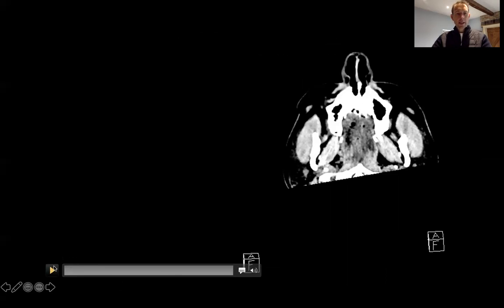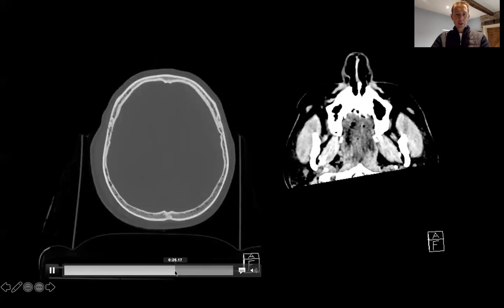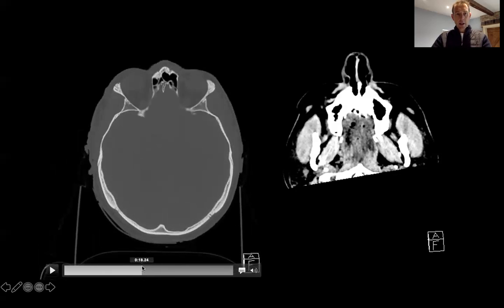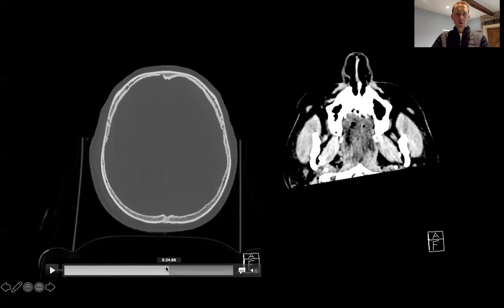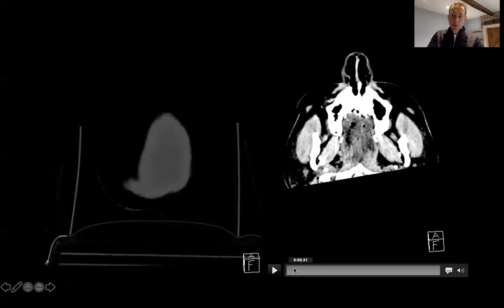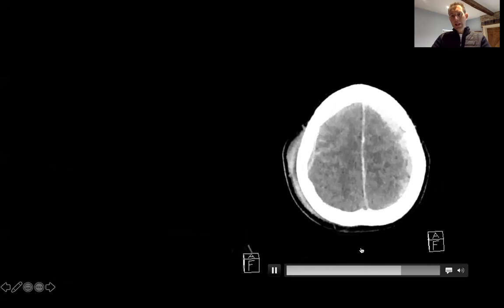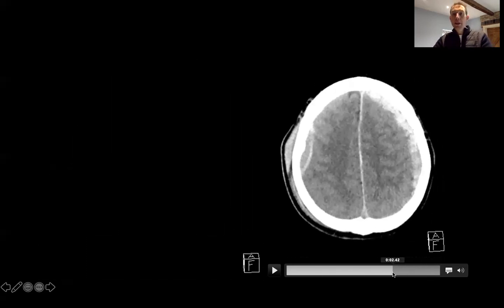When I report, I tend to move from the outside to in, and I report the soft tissue injury, followed by the skull fracture, followed by the extra-axial hemorrhage, followed by the brain injury. And I know some people will argue against that and just primarily focus on the brain, but this is a case in point where I think it's important to work your way from outside to in. If you're very experienced in trauma, then fair enough. You'll be able to spot the different abnormalities anyway. But I think particularly when you're first starting off, having that systematic approach will make sure you don't fall foul.